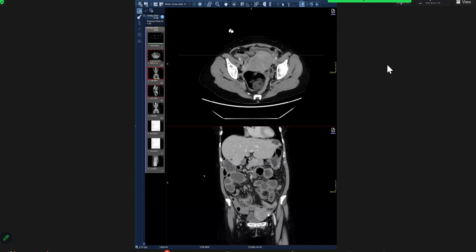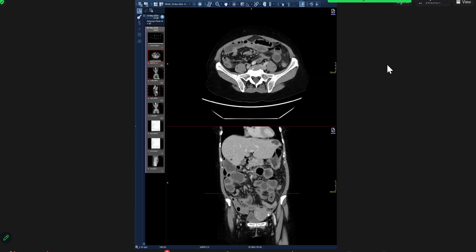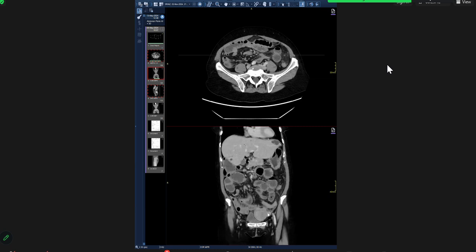Whether you know the case or you do not know the case, you have to go on. You have to complete your description and then come to it, and then we can go on from there. So I want you to describe. Yes, ma'am. I want to see the appendix as it is the cause of one of the emergencies. So the appendix appears to be fine. Yes, ma'am, it's fine.